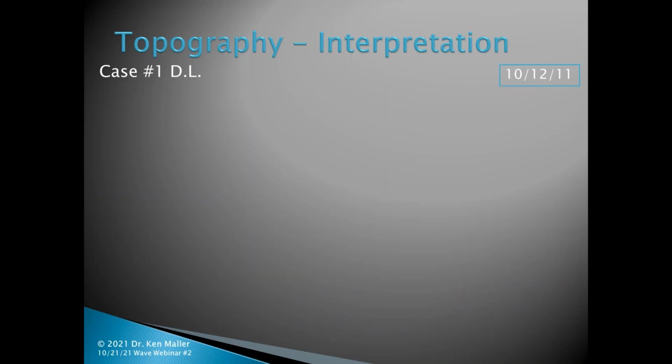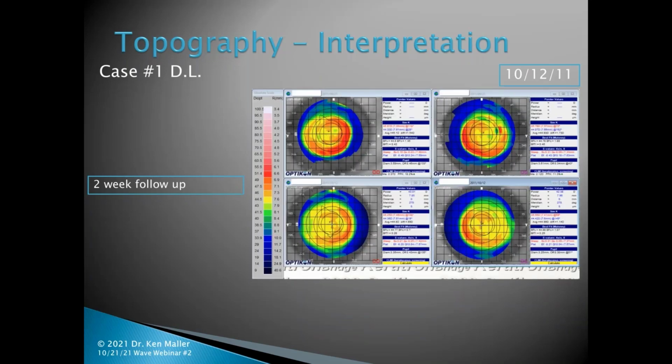She came back in 2 weeks and listened to me. So this is 3 weeks now after I'd first seen her. And we can see now that the keratoconus is magically improved. Now, anyone who's taken care of keratoconus knows that keratoconus never improves like that. And so I was able to convince her that she really does have corneal warpage, and this really is a soft lens-induced problem, and this is not the corneal disease that she was told she had. And so she can relax and be calm.